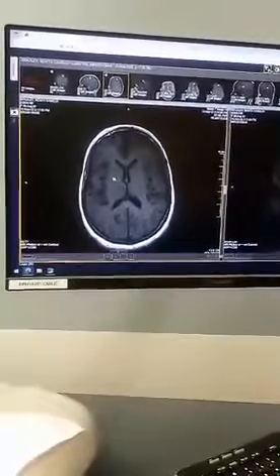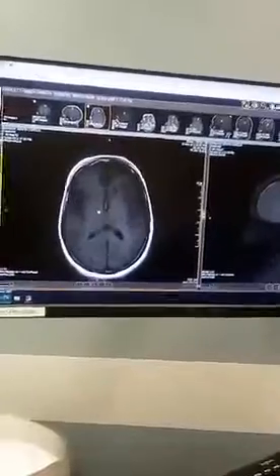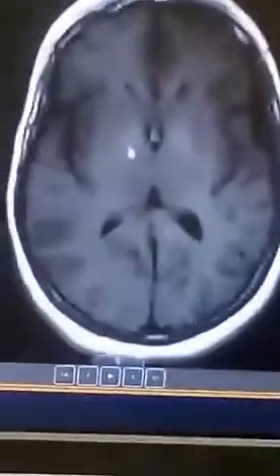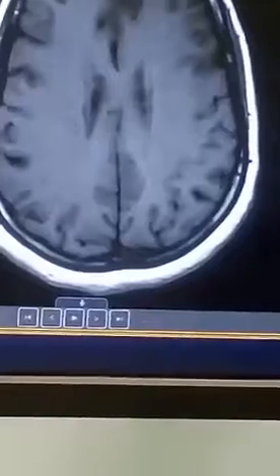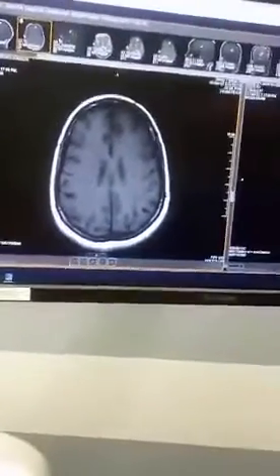So there's a little hole there. That could be a little small stroke from the past. It's a little hard to say for sure. But this is all old, and it really doesn't matter what's here.